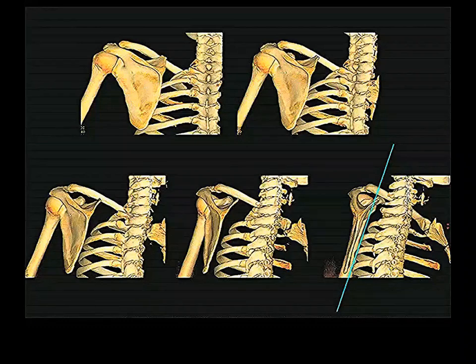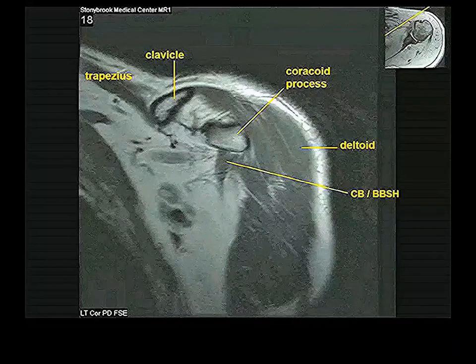You almost always think to yourself, gee, supraspinatus and infraspinatus, they're on the back, so any section should get them together. But it's because of this different angulation between the upper part of the scapular blade and the lower part that a perfect section in the scapular plane is going to get through supraspinatus and subscapularis. And then really you don't get infraspinatus until virtually supraspinatus is out of your section. So I just want to say that because that'll explain what we're going to be seeing.